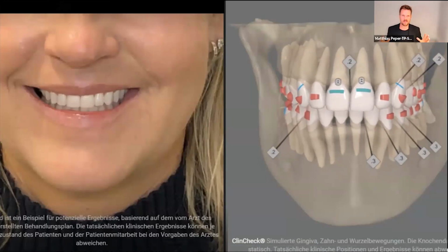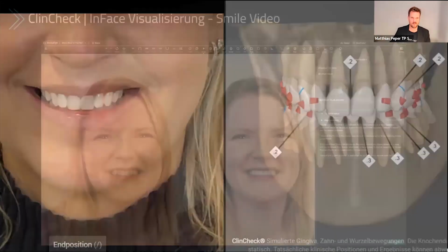So what I would like to explain is, don't check the sequences first, check first the result from every different view, if this is really 100% what you would like to achieve. If not, go back and explain exactly where you want to go.